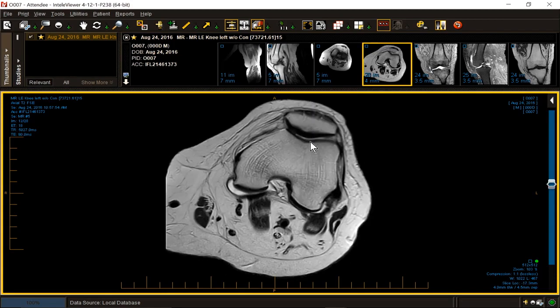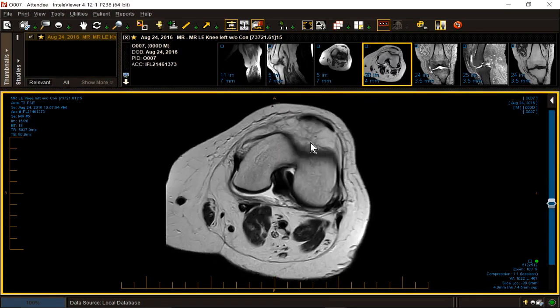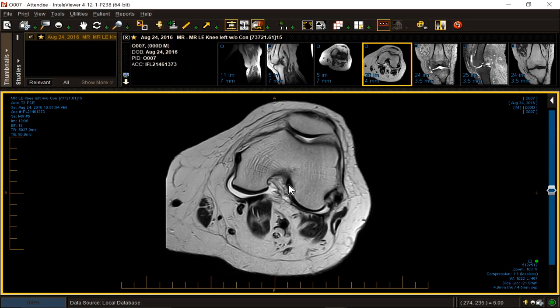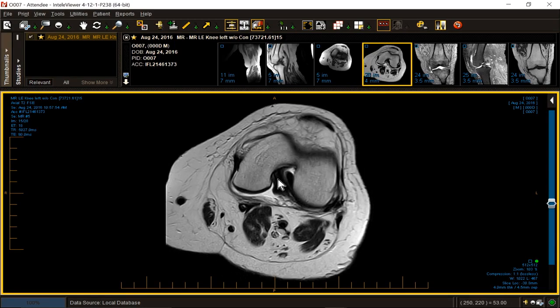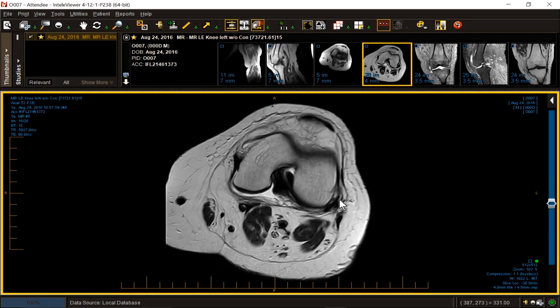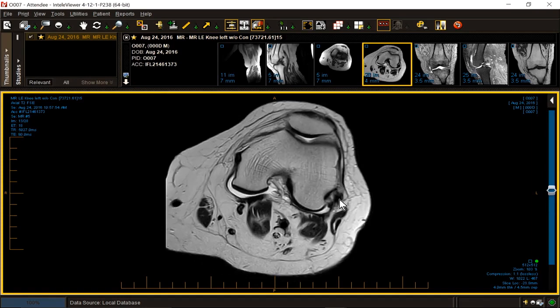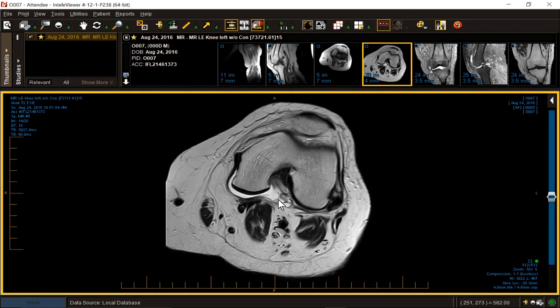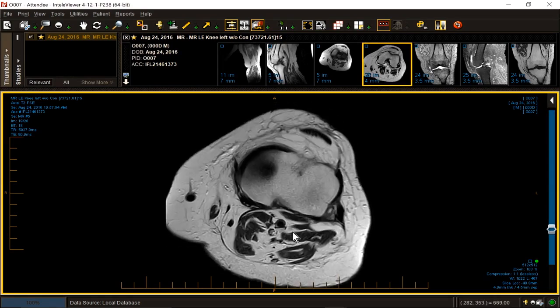I'm going to start out nice and slow. How many osteophytes do I have? How's my anterior cruciate ligament looking? Pretty good on the femoral end. How's my PCL looking? Pretty good. How's my tibial collateral? Pretty good. How's my posterolateral corner? Not very edematous. How's my capsule? A little distended. Is there capsular prolapse? No. How's my neurovascular bundle? Terrific.